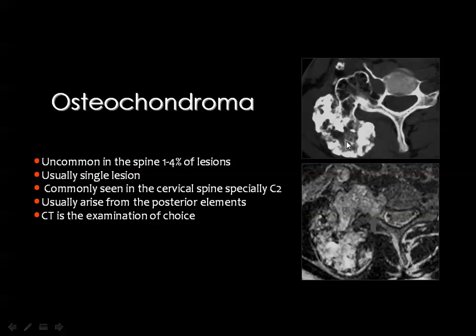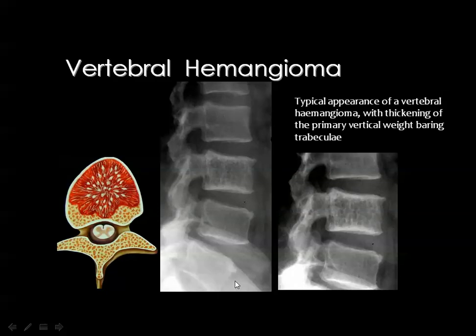The medullary cavity is continuous with the medullary cavity of the original bone, and the cartilaginous cap is usually better seen by MRI, especially the T2 weighted image. And remember that this cap should not exceed 1 centimeter in thickness, and the underlying bone is intact, to consider the benign nature of the lesion.